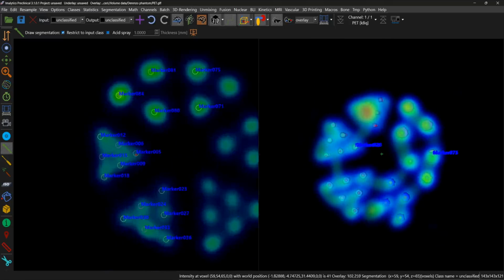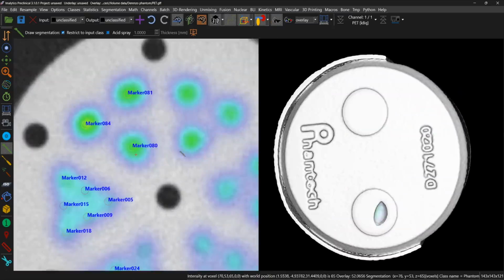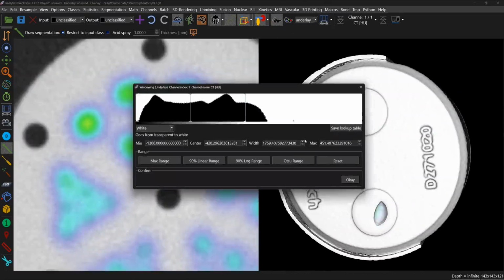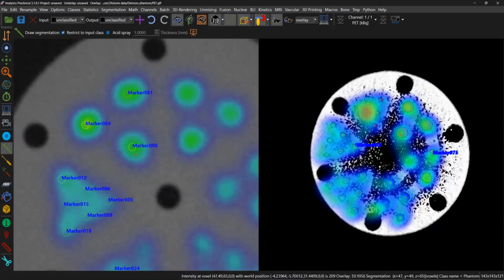So for instance here, in this 2 millimeter, I'll turn on the underlay so it's a little bit easier to see as well. Let me just adjust the window here. So for each grouping in one plane, what we do is we take the geometric center of the rod and trace a line profile from that geometric center to all the adjacent neighbors in the same grouping. So for this grouping of 2 millimeters, what we would do is a line profile from here to here, here to here, and here to here.